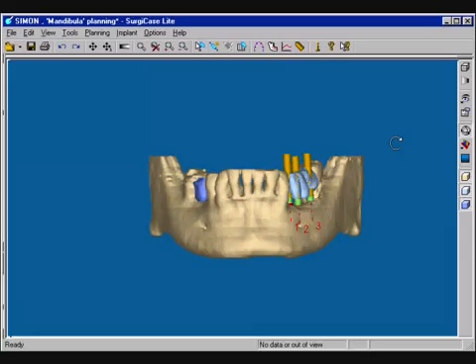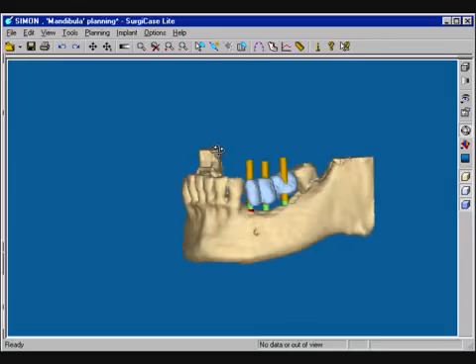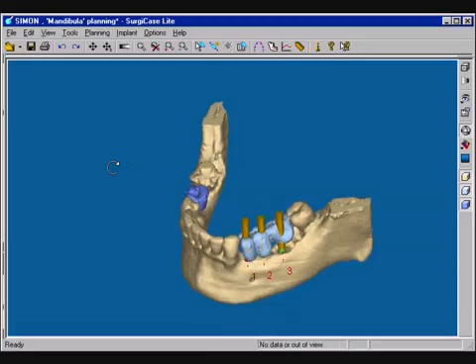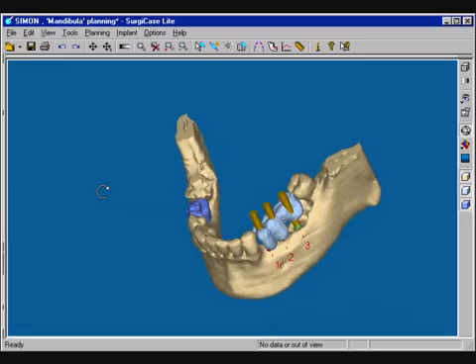You can change in the shape of the cursor, and as you move closer to the direction of the 3D model, it takes it across it. By holding down the left mouse button and moving, as you move your cursor farther away from the model, it takes on a circular shape and now allows you to rotate interactively around an axis perpendicular to the screen.